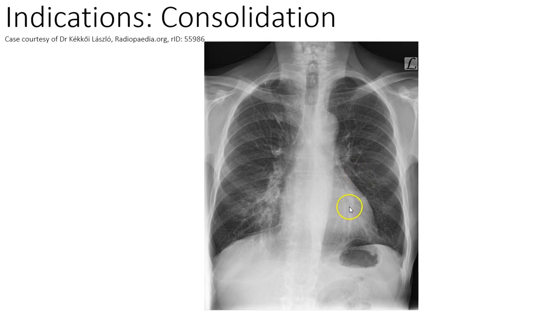The location of that consolidation, if I had to pick for postural drainage or for positioning somebody for VQ: I don't think this is in the bases of the lungs, because these hemidiaphragms, this angle looks pretty clear. I would say this is more in the middle zone of the lungs, on the right middle lobe. That's what I would mainly pick to treat. I would be aware that there might be something in the left lingula or the top of the left lower lobe also going on.